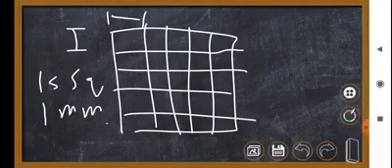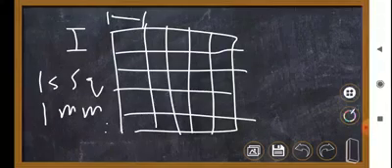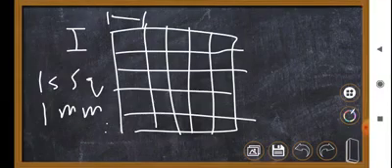Some calculations are given in millimeters, for example, the duration of the P wave, PR segment, PR interval, T wave, QRS. In further lectures we'll be discussing the duration, so these measurements and these units are going to help us to understand it further.